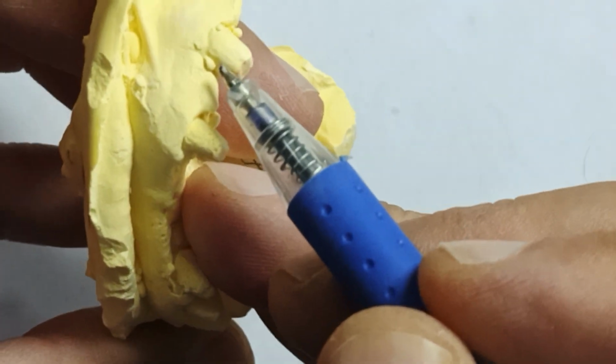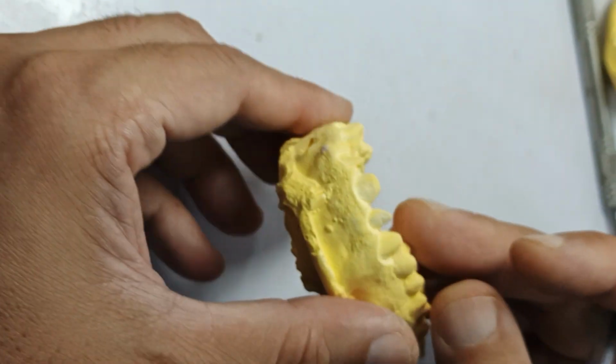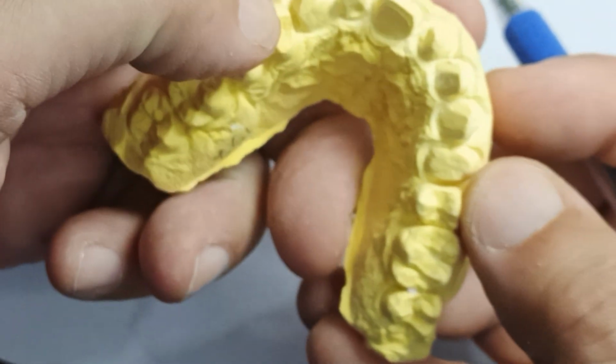There's a bubble right there. There's a bubble right here. What are they going to do? Nothing. Look at next one. Come here. Look at these. They just cut these front teeth. 1, 2, 3, 4, 5, 6 teeth. 7. They just cut them.